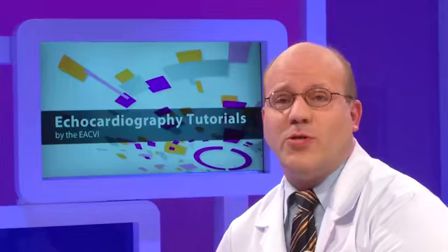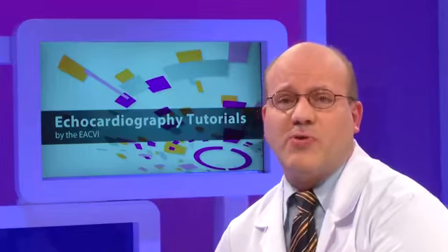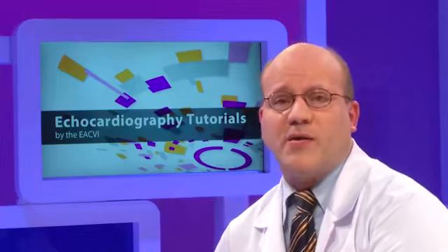So I hope I could show you how you can use tissue Doppler and speckle tracking for quantifying regional and global myocardial function. So the key messages of this examination is that first we have to optimize the image quality, to optimize the settings for the different modalities, but also to record several loops, and finally to take into account that we have to look at the valve in order to have a good timing for an appropriate analysis of the data.